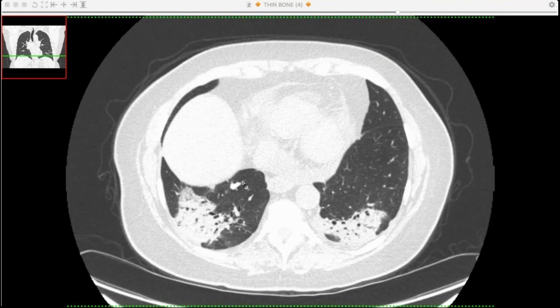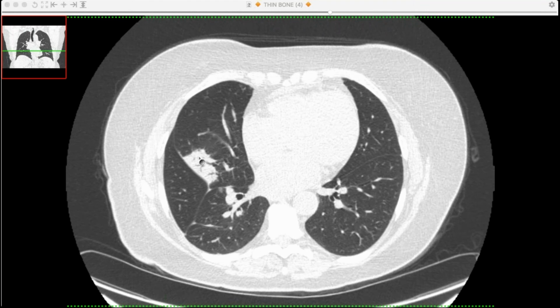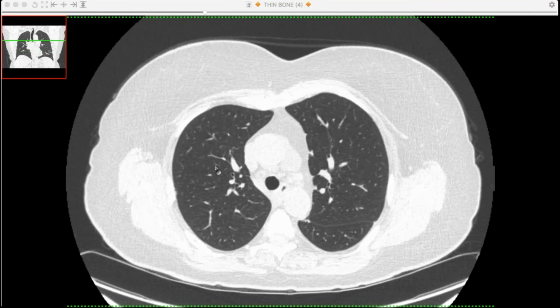So the lower lobe stuff started to clear up eventually. Same thing with this middle lobe mass. It got a lot smaller. Notice the airways are maybe a little juicy, and you can see that in organizing pneumonia, and it's not true bronchiectasis.